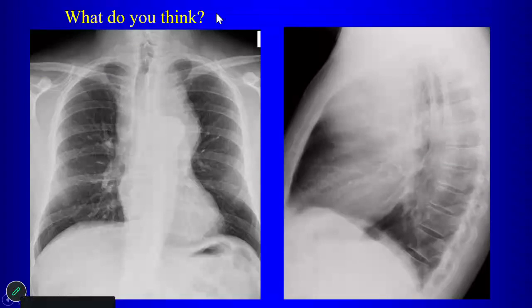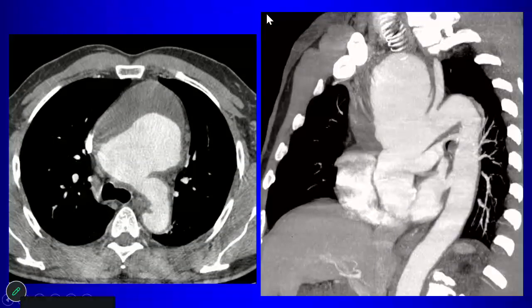Big anterior mediastinal mass in this case. Sultan, you've received a request for a biopsy, and the tech is asking you what position would you like the patient in on the CT table. What are you going to say? I say, let's get a CAT scan first. I don't know what we're looking at. And you want a CAT scan with contrast, and it shows you that this represents what? Definitely don't want a biopsy. So what is this?